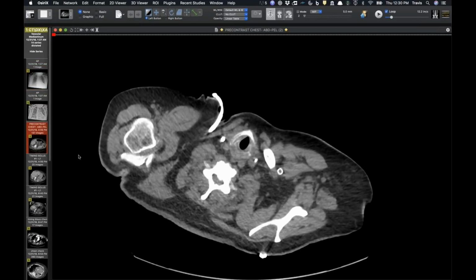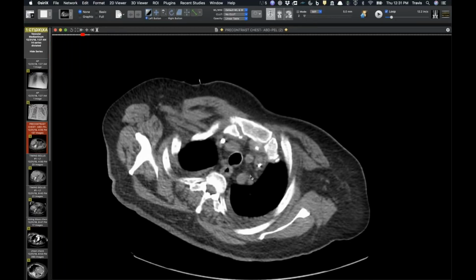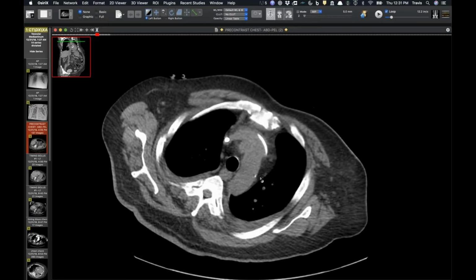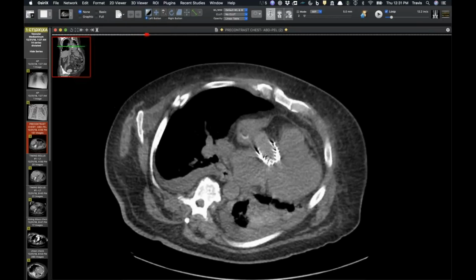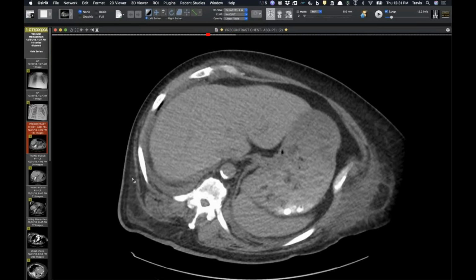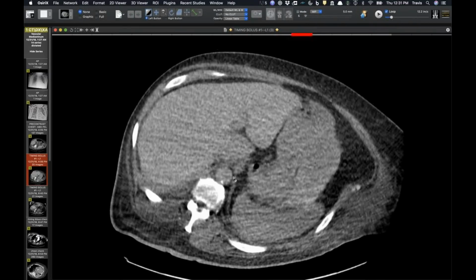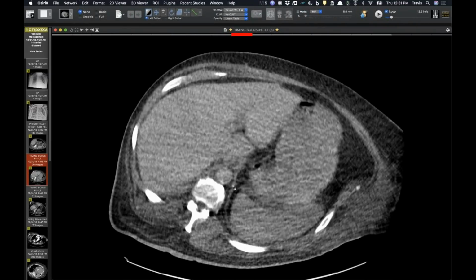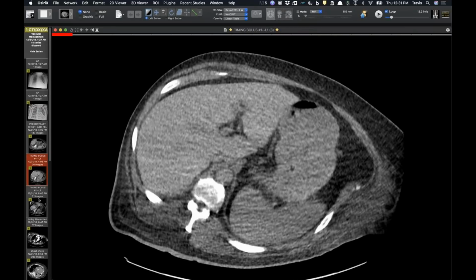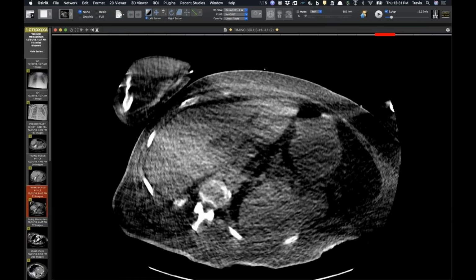Now, my fellow was on call, and they did a non-contrast study, and you can see it does go into the vein here and goes across midline. This was the non-contrast study that they were doing as an angiogram because he was actually having lower extremity ischemia. Then they tried to do the lower extremity angiogram, and you can see on the first timing bolus, there's a tiny bit of contrast getting to the aorta, but not much. They tried again, still no contrast getting in there.